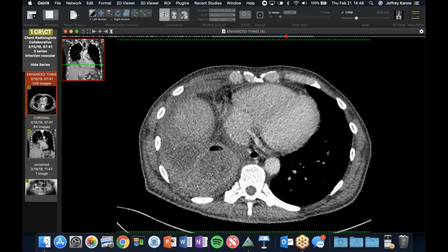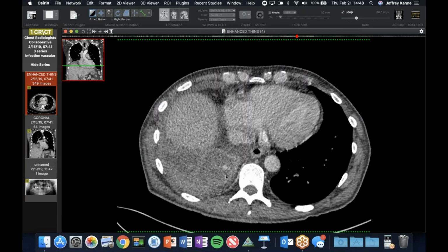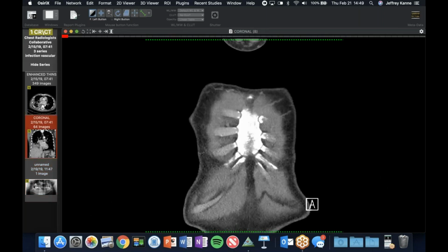And so this is being treated medically, but it was funny because with the history, they did do a Panorex, and you can see these are pretty bad teeth. There's a bunch missing. There's been a lot of work, and there's actually a big cavity right there. So I don't think it's actino. It's acting more like a pyogenic abscess. But bad teeth, aspiration, anaerobes, all sorts of bad stuff like that, causing a pseudoaneurysm.